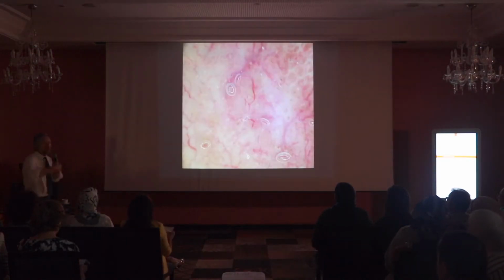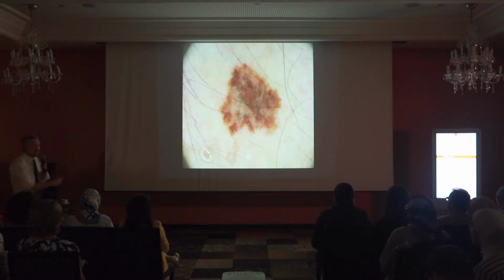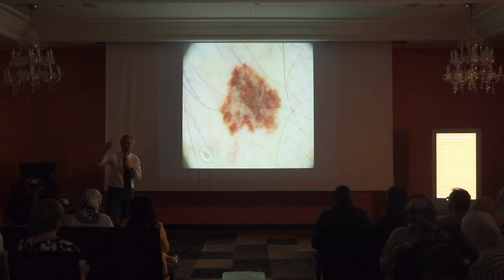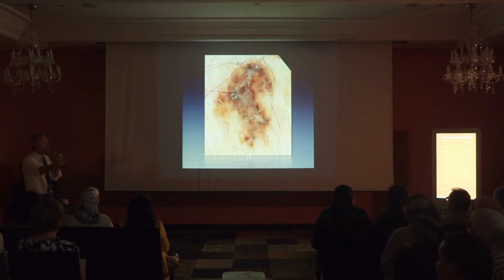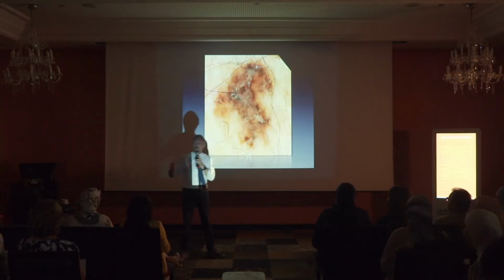Okay, so then let's continue with this patient. BCC, perfect. So we have 2 BCCs and 1 dermal nevus. Then, what about 10? Melanoma, perfect, in situ. So he has 2 BCCs, 1 melanoma, 1 dermal nevus. Number 11, melanoma: 2 melanomas, 2 BCC, 1 dermal nevus. Unbelievable.